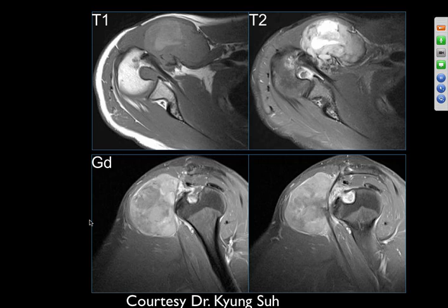Axial and sagittal images from an MR demonstrate a heterogeneous mass anterior to the subscapularis, which demonstrates peripheral enhancement. Again, I think this looks like synovial thickening with probably a PVNS. Yeah, but it's very inhomogeneous here, more so than I typically see with PVNS, and we're not seeing a lot of low signal on T2. But this was PVNS, operated, very mass-like. Just looking at this without a history, I'd be more concerned about a sarcoma.